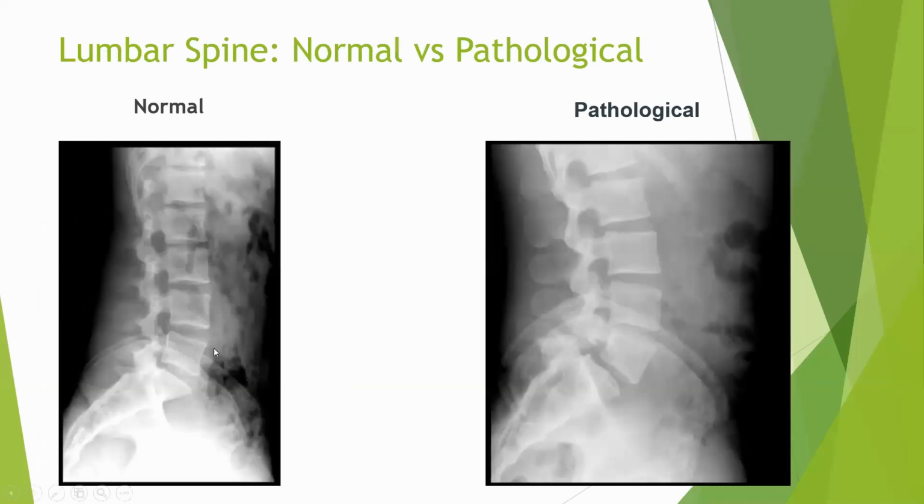Next, normal spine. All right. In the book that I am referring to, it said it is normal, but do you think it is normal? Honestly, I don't see a normal spinal lordosis. To me, I don't think it is normal, but normal could be just because someone is not showing any signs and symptoms, then the patient is normal. So this patient could also have no signs and symptoms, and that's why it's normal.